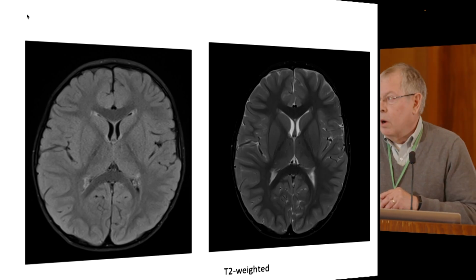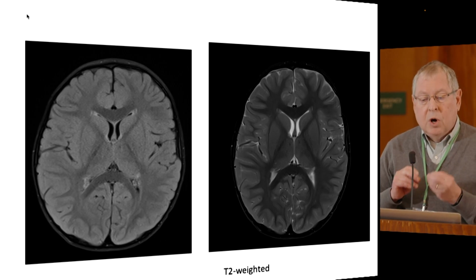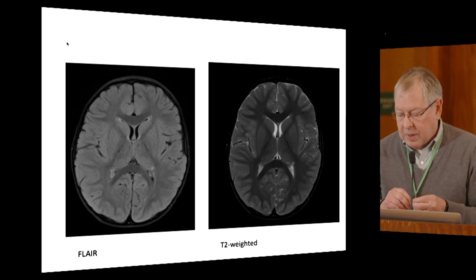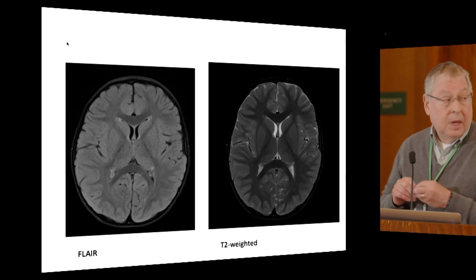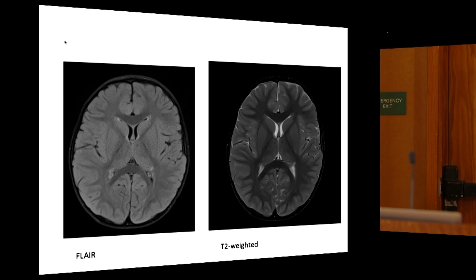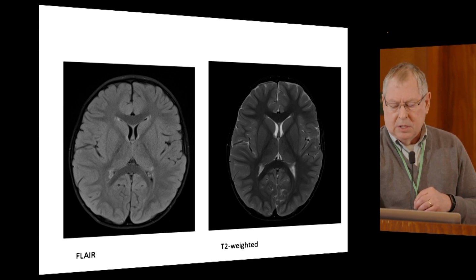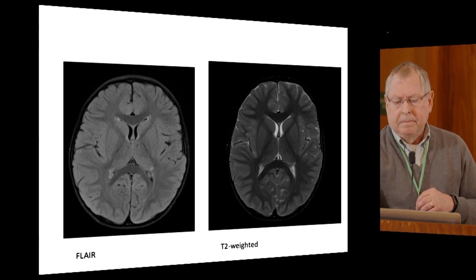And what characterizes them? The thing about T2 weighted images is that they look at myelin very well. What it's looking at, I'm just going to point, is these dark bands, that's the myelinated white matter fibers. Let's see, do I have a pointer in this? No, I guess I don't.